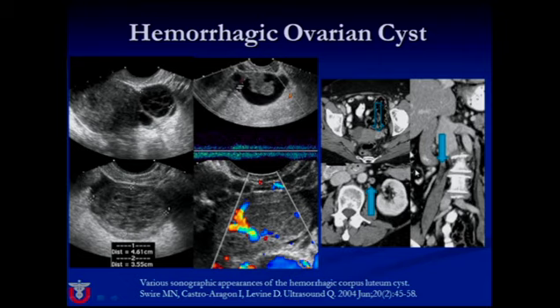Here on a CT scan, you can see an adnexal cyst on the right and a little enhancing thing on the left. Now, normal corpus luteum can do this on CT, but continuing looking, note that there's a filling defect in the left ovarian vein and a filling defect in the right ovarian vein. And in fact, this patient had low-grade postpartum sepsis, had developed bilateral mild septic thrombophlebitis, and this was in fact hemorrhagic involvement of the ovary secondary to impaired drainage by the clot.